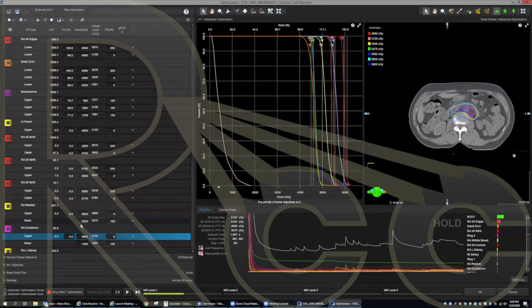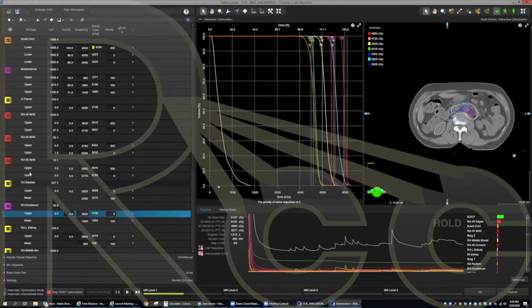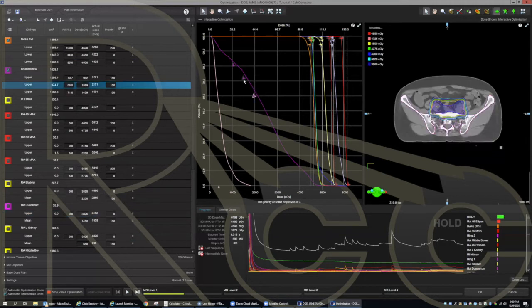because again, I can see where it needs work. So in each step, I'll just take a quick look. So bone marrow, you can push it a little bit. Bone marrow is really tough. Again, we just want to sort of keep it there. You can push it. In certain cases, I've really pushed it. And then I would just go through each one again.